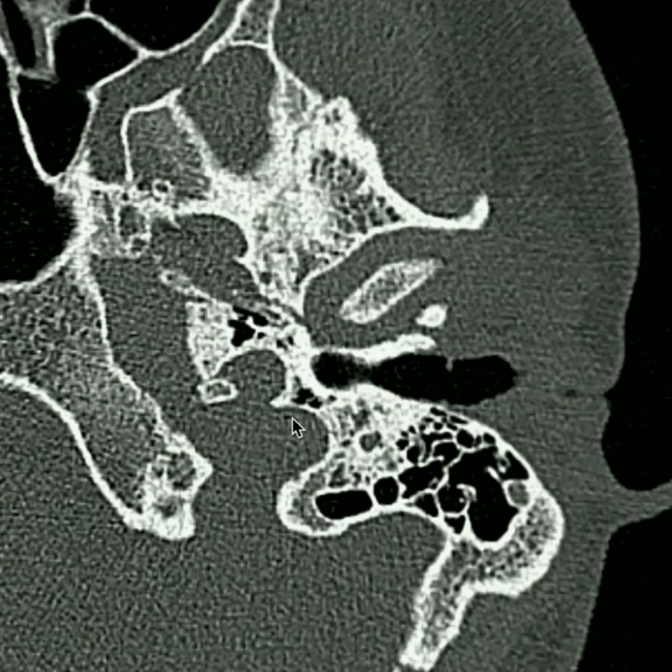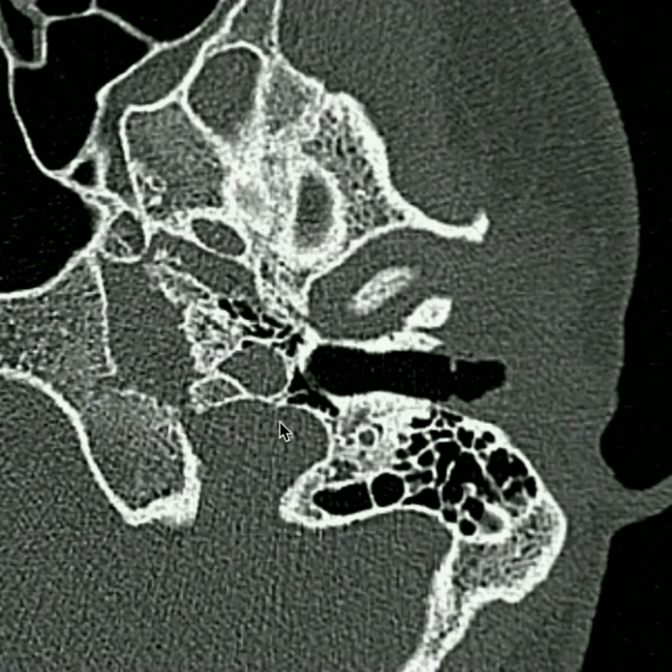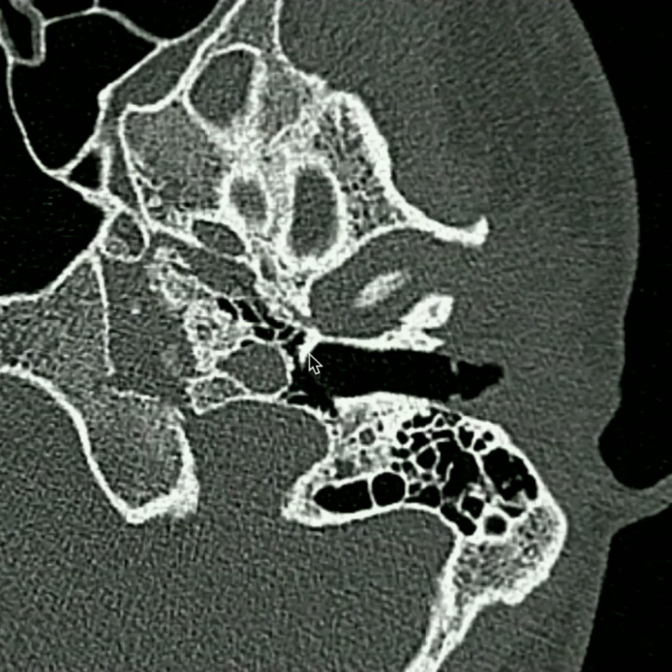Here I am scrolling up, and now we see this little opening developing off the jugular bulb that seems to be right on the carotid-jugular spine, right here. Scrolling a little further up, we see it right here and can see it enter the middle ear cavity more laterally. This again will house the Jacobson nerve as well as the inferior tympanic artery. Now let's look more laterally.